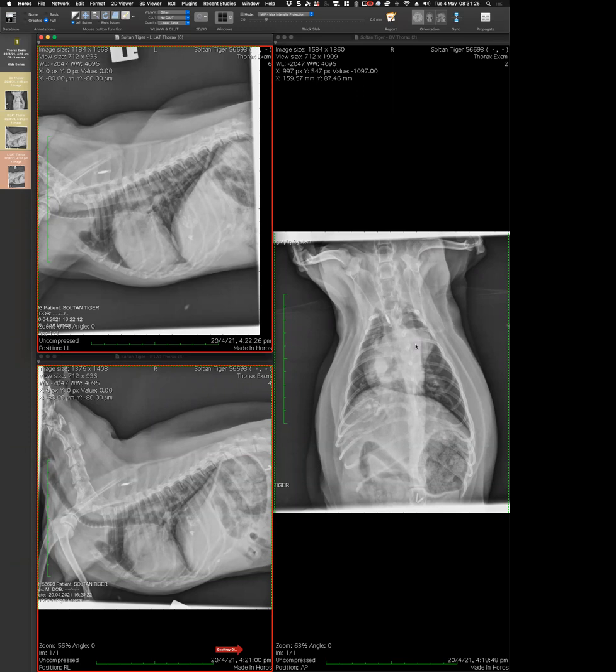Maybe it's the right ventricle. I'm wondering if this also, the pulmonary vein is much larger than the pulmonary artery as well. And I'm wondering if a dog has heartworm disease. I don't know if that's a differential that's going to cause this. Okay, so now you have a hypothesis. Try to sell it to me.